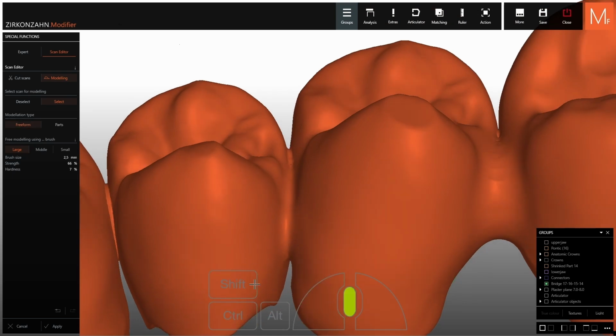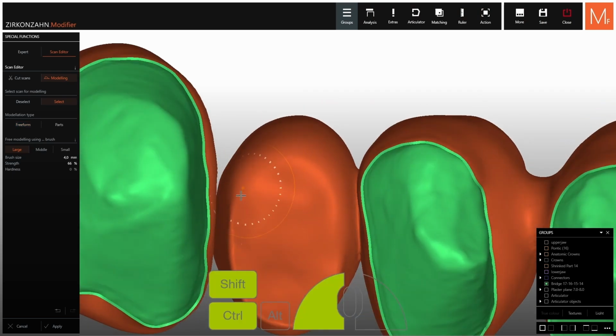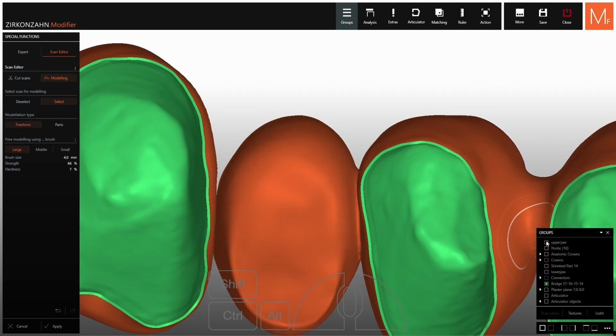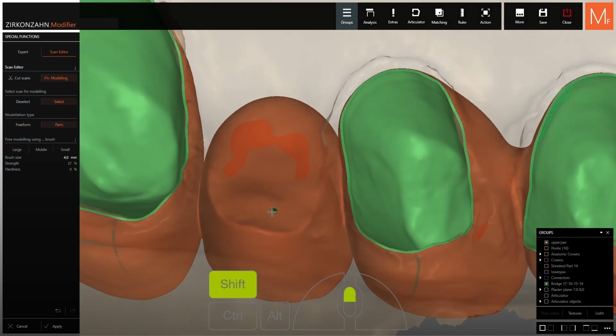The pontic region, for example, can be refined to achieve a more natural contour. Displaying the model simultaneously helps evaluate the tissue profile and allows certain areas to be extended slightly downward. This adjustment can create a controlled amount of pressure for proper tissue support.